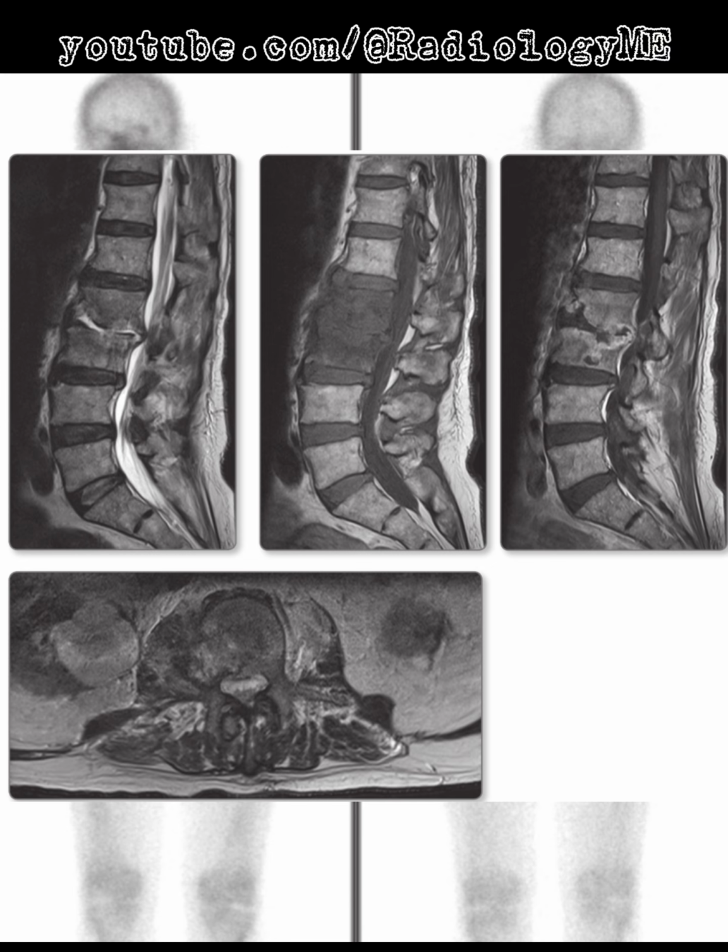The L2 and L3 vertebrae show low T1 signal, which is classic for vertebral body involvement in discitis. What's also important is the avid enhancement following contrast, which strongly suggests an infective process. The axial T2 image shows high signal in the adjacent psoas muscle, likely due to a psoas abscess. This is a common complication in discitis, and we can see a focal collection here, particularly on the left.